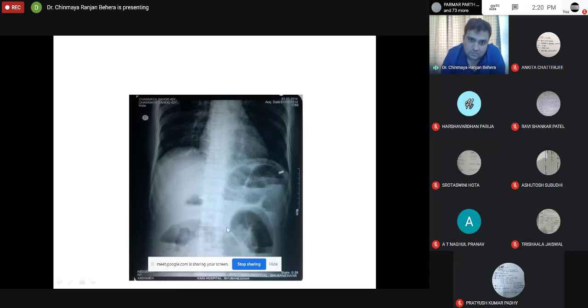Okay, and when you see the ileum, there are no specific markings there. They are just placed like this. Here can you see any spiral binding kind of thing? No. But here you can appreciate it. So these are jejunal loops, and this is an ileal loop. Ileal loop is called structureless, that is why. So this is valvulae conniventes. Okay, this is structureless ileum.